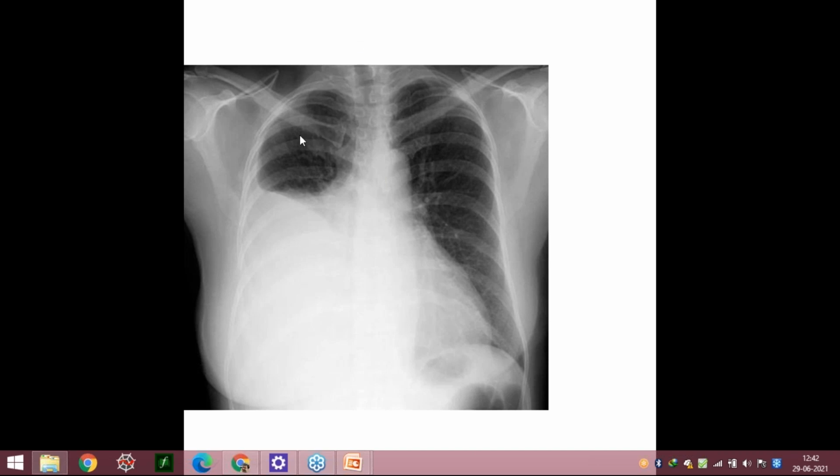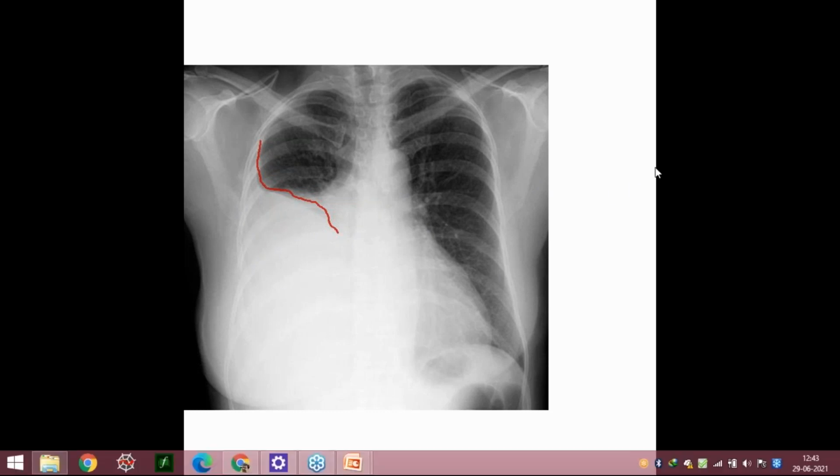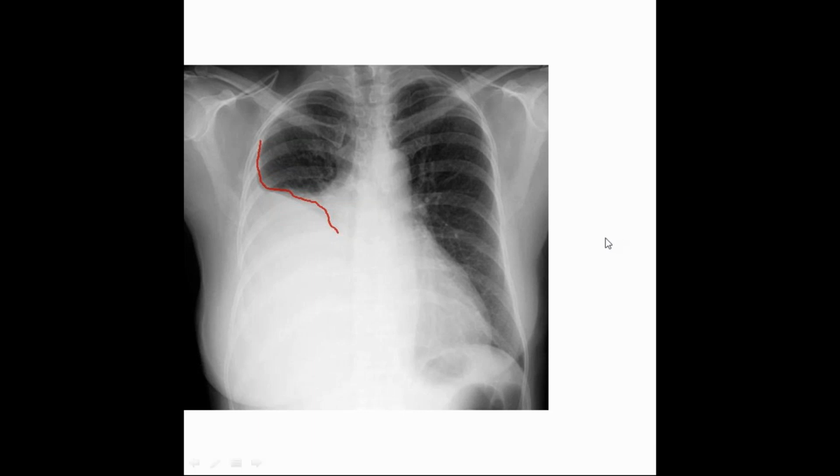Airway is fine. The breathing, if you see, you are not able to visualize the right middle and the lower zone. Yeah, probably empyema or probably a pleural effusion. Basically, there is blunting of the angle. It is not a sloping opacity. This is basically the Ellis S curve that you see. So this is the curve. This is pleural effusion on the right side. There is blunting, and it could probably be empyema, but if you can see the ribs are there, so probably only a hydrothorax.